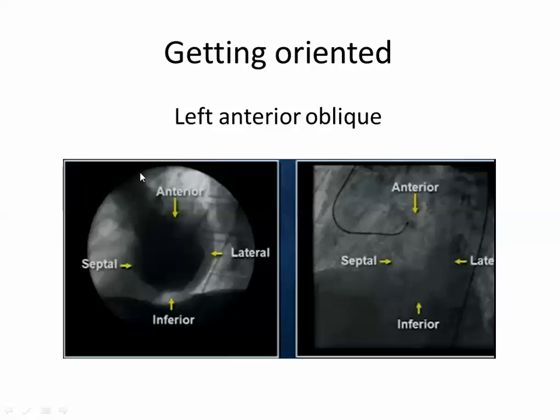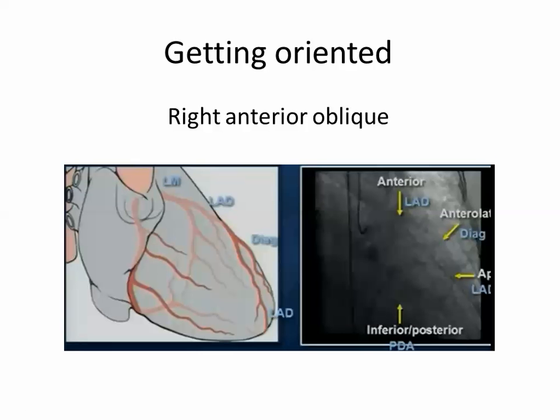Here, this is the aorta. In the aorta, this will be the left coronary cusp, and this will be the left and the right, while here this will be anterior and posterior. This is anterior and this is posterior, the LA.